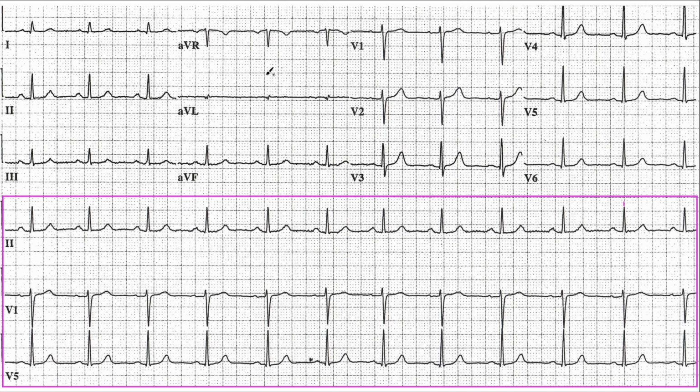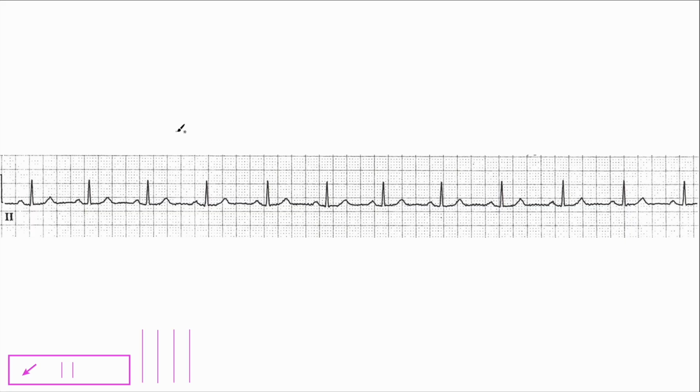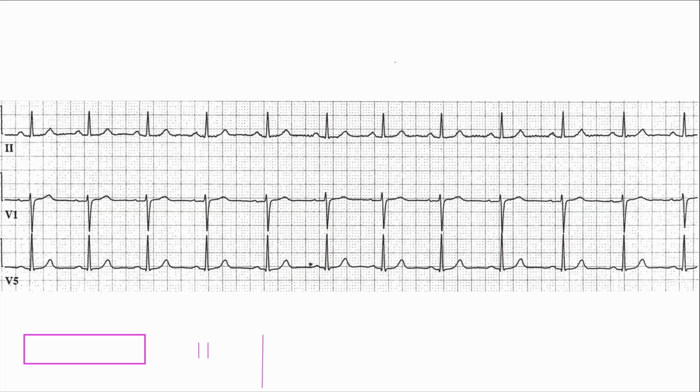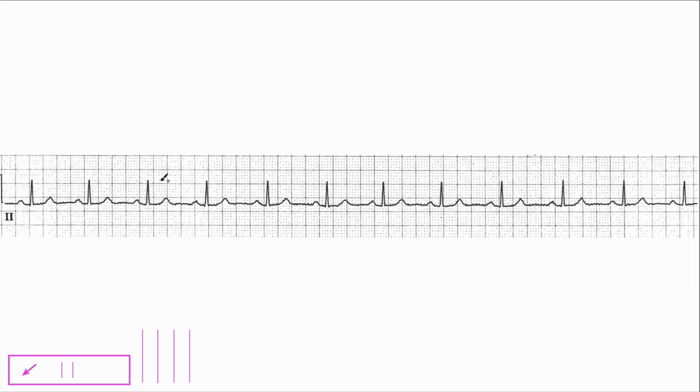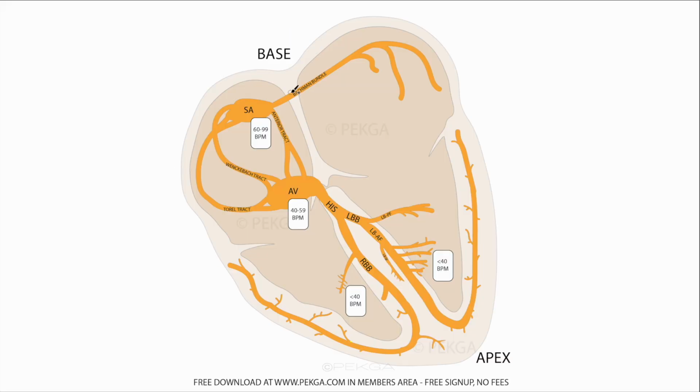Again, we're building up to this 12-lead ECG, right? We're just going to break it down, and I'll show you here what happens in a telemetry setting versus a clinical setting. So in a telemetry setting, typically you will be dealing with a single channel, maybe 3 channels. Depends on the devices that are being utilized and depends on the setup on the devices. The most common channel that's used in cardiac telemetry is channel lead 2. And the reason why it's used is, well, we'll come back to that right here.